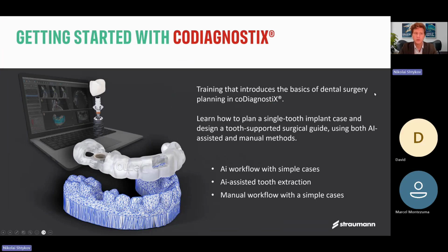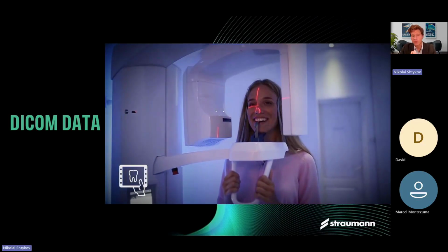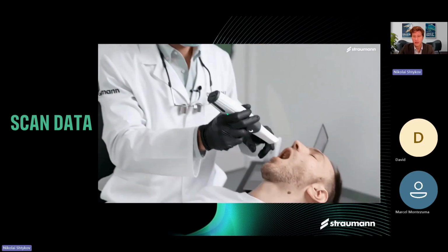Our topic today is getting started with coDiagnostiX. We will go through a simple case, step by step, showing how to perform the case in coDiagnostiX. We will start with the workflow data. For the data acquisition, we need DICOM data and scan data.